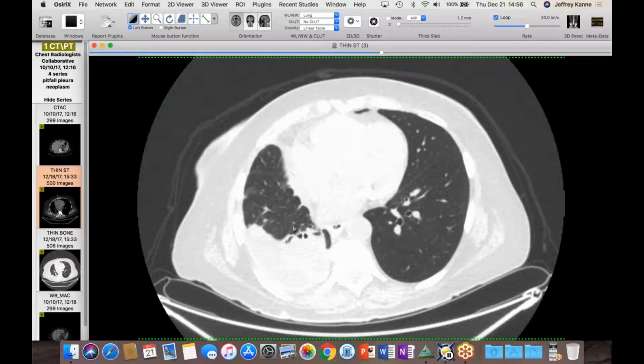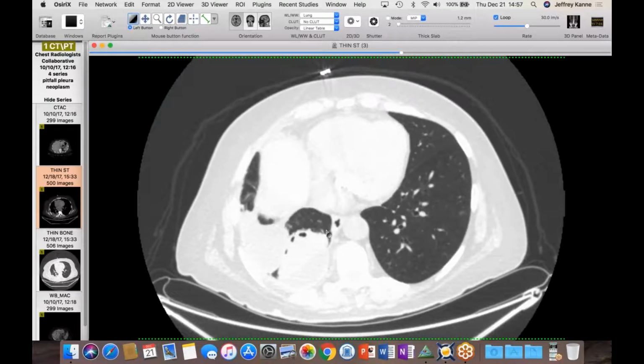I do. I just say rounded atelectasis. So, this is really unusual, and I don't know what to make of it, because otherwise, just looking at the CT that you showed, it sure looks like just rounded atelectasis. It really does.